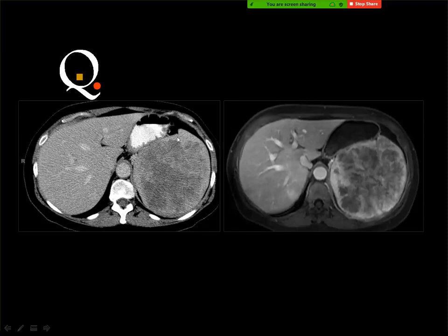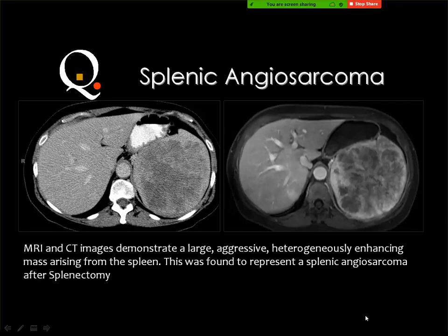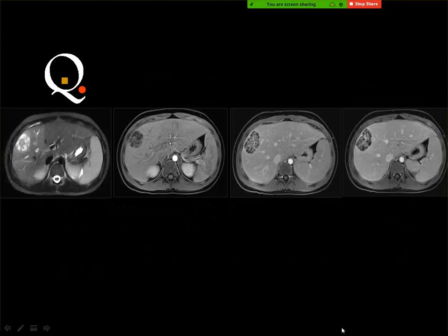And this is the splenic tumor. And I said before that whenever you are asked about the differential diagnosis, you mention the primary lesion in this area, then you mention lymphoma and metastasis. Then what is the primary lesion here? Angiosarcoma? Yes, and this is angiosarcoma. Then you start first by the primary lesion, although it may be rare. But you say that this is angiosarcoma. Then what are the differential diagnoses? Then you mention lymphoma and metastasis. Okay.